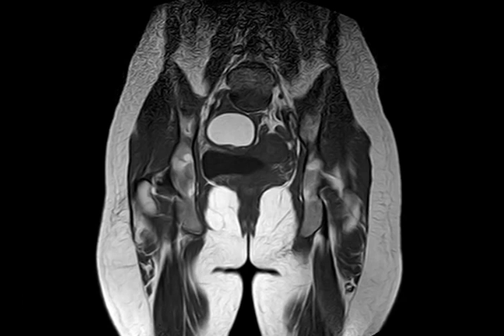And in order to see the enhancement, you need to do T1 fat saturated. Why fat saturated? Because it is hyperintense on T1. How will you see enhancement in something that's already hyperintense? You need to suppress the fat in order to see if there is enhancement.